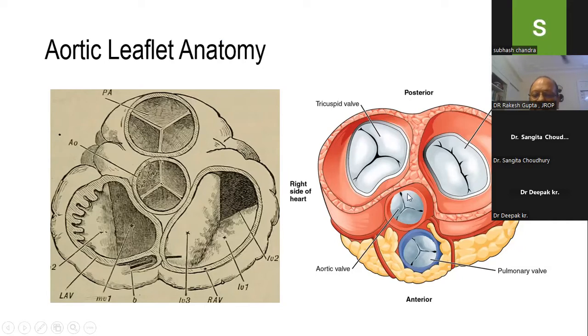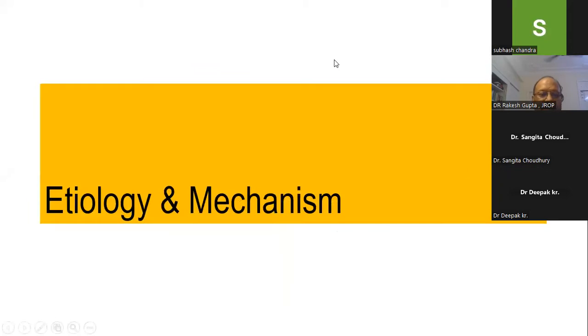And why is the aortic valve multi-directional? Suppose this is the aortic valve, this is a closed aortic valve. When it opens up, like I told you, the jet in eccentric could be in this direction, in this direction, in this direction. Any direction, the jet could be possible. So that's why we spend time when we have got aortic valve stenosis in our day-to-day practice. So let me just show you those valves.